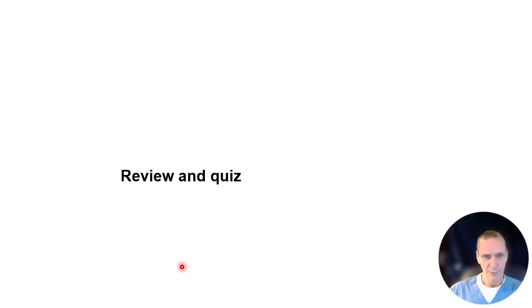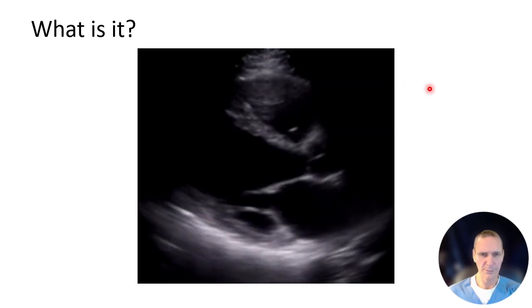All right, now we will do a review and quiz. I'll show you some images and let you just think about what you might be seeing.